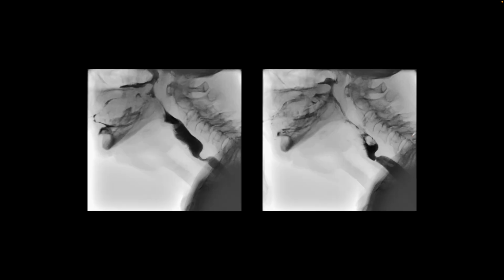Here is our next patient. We have performed a barium swallow, and we find that this patient has a prominent cricopharyngeus muscle seen here, a small esophageal web seen here, and also the contrast. I don't have the dynamic images to share, but when they swallowed, there was a reflux of contrast into their nasopharynx, and we don't see it clearly, but some of the contrast is tracking superior to the palate.